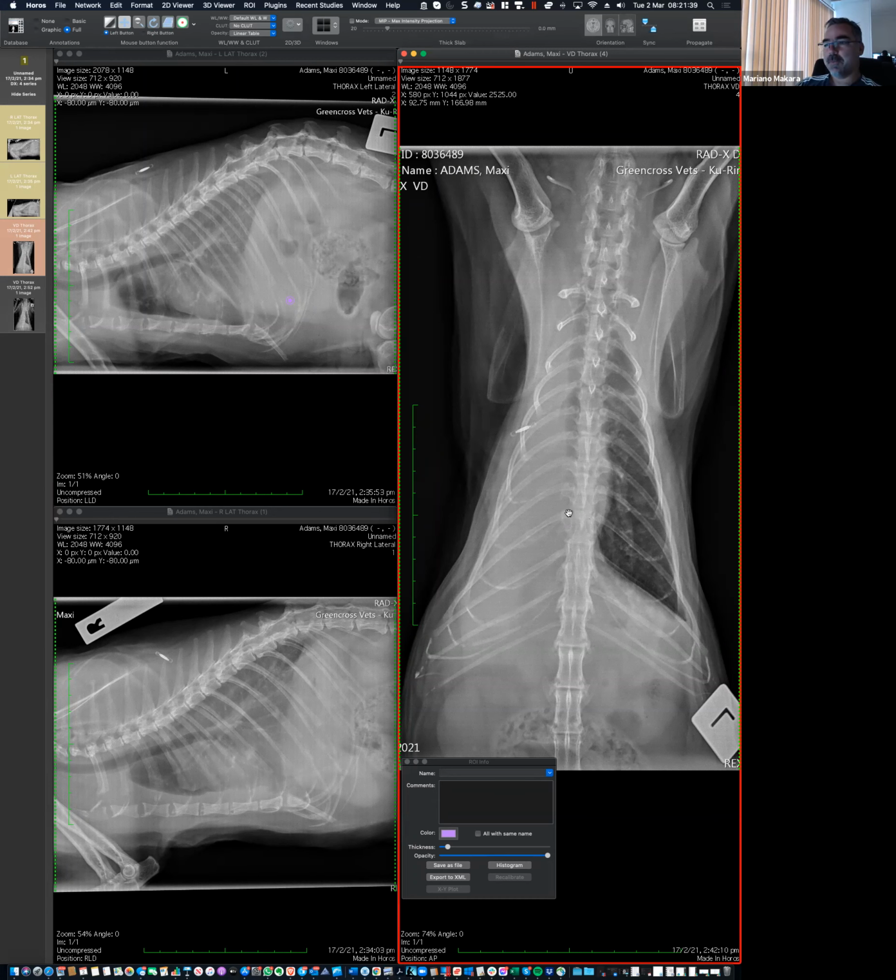And this is probably a good report that would just describe what is happening and then have different paragraphs hypothesizing one possibility, another possibility, and another possibility. This would be a long report. The description would be a very short description because we went through it: there is increased opacity in the right hemithorax, there is no mass effect, there are possible nodules in the thorax, and then we haven't gone into the abdomen, but that would be the description, very easy.